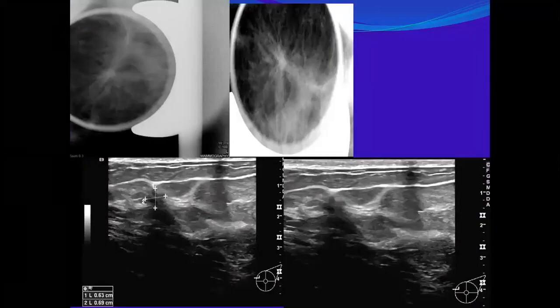I'll say real abnormality. Why? Because we said if it persists as a parenchymal island, even in a spot magnification, you might find it as a normal variant. So when I have seen it, it is a real abnormality. But is it a pathology or not, this I will go further.